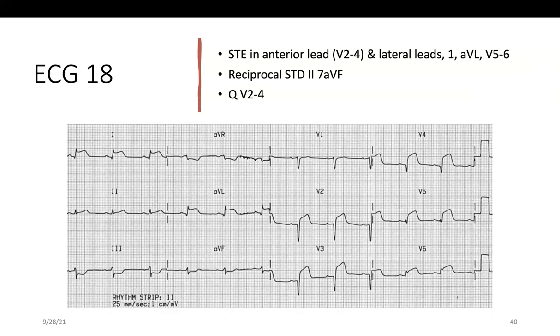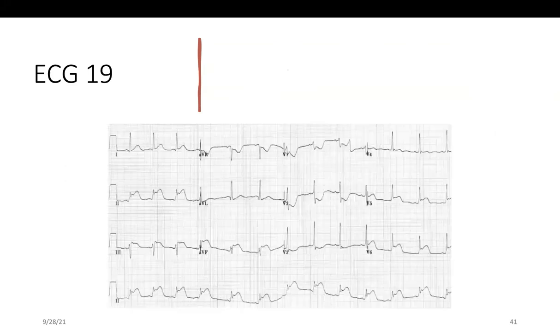If it's after the first septal but before the diagonal, then you will find the anterolateral ST elevation. Of course, in ostial, you will find anterolateral plus AVR. If AVR is not there, as here, then most likely it's after the first septal. Of course, this is not 100% accurate because of collateral blood flow and so on. Okay. 19.